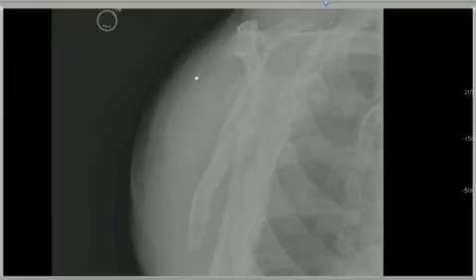Sometimes one sees soft tissue opacities adjacent to the shoulder girdle, especially on digital films. That's just the normal muscles, seen to good advantage with digital technique.